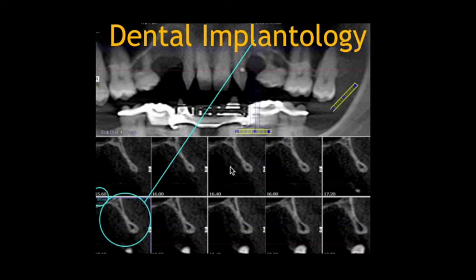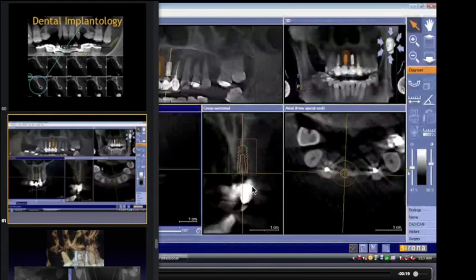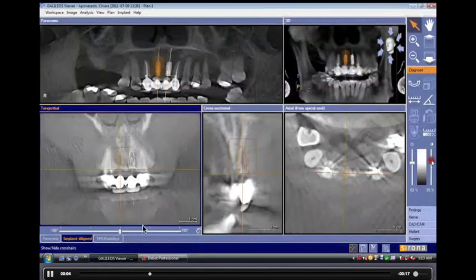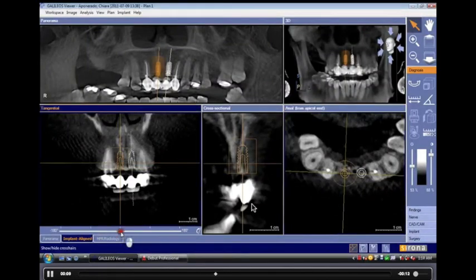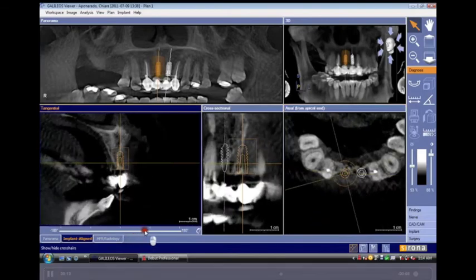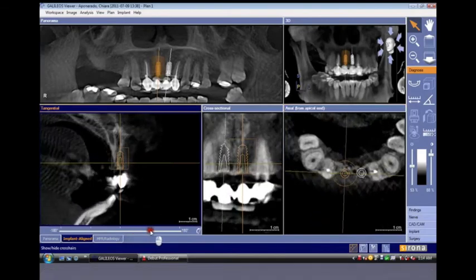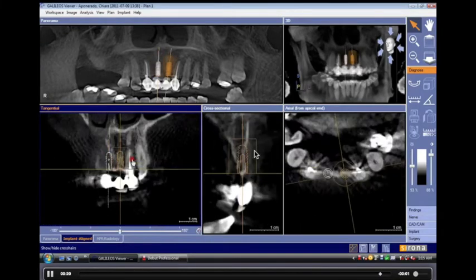Implantology, of course, that's where most of CBCT is directed. We could actually determine how much bone there is, and not just that, we could even plan ahead of time where we could place the implants. And in this case, we could tell our patients what our plan could be, how predictable it would be. Like in this case, I've told the patient we cannot place an implant because obviously there's no bone, not unless you want tooth coming out of your palatal vault. That's where the bone is.